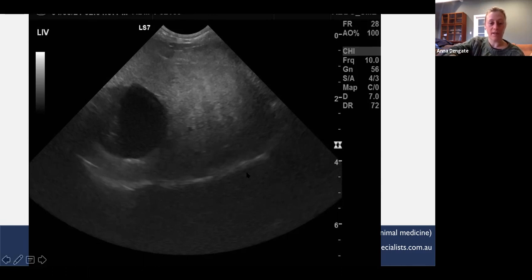For when we're just practicing assessing images, obviously. But just for context, this is a dog with Cushing's disease and probably hyperlipidemia, being a schnauzer as well. So the liver was quite bright. And the other thing that is very subtle, but there's actually a really subtle thickening of the gallbladder wall there as well, which we do sometimes get with hyperlipidemias.